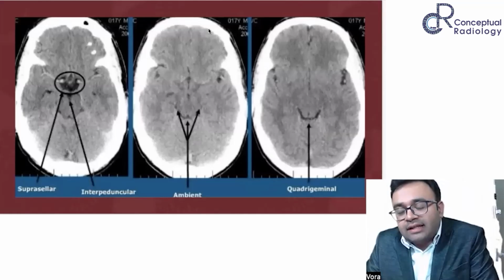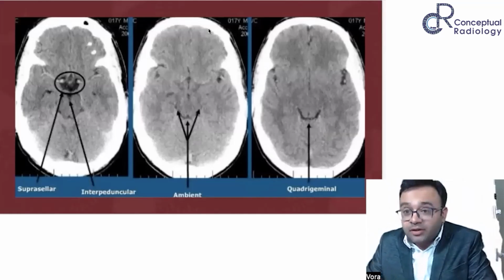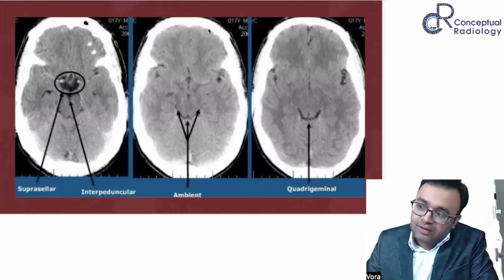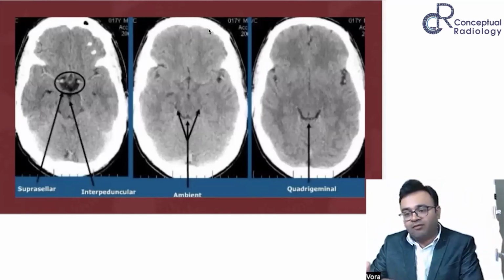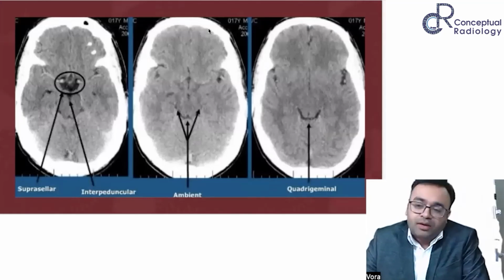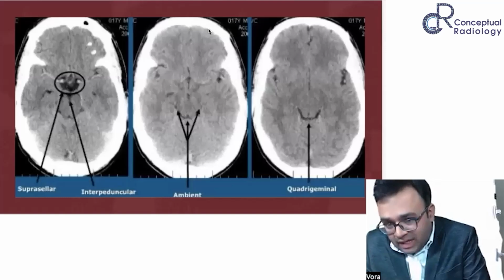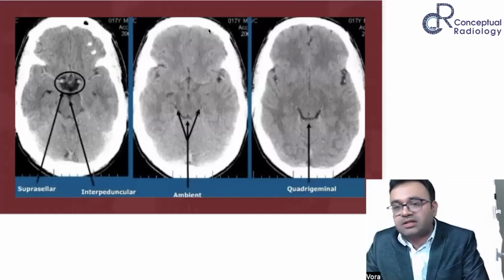What I've realized is that most radiology residents and neurosurgery residents also become too fixated with midline shifts. And trust me, if that is going to be the case, you're going to land up with a situation where you are going to end up losing a pediatric patient. First of all, for pediatric head injury, the brain is very, very robust. It is a very growing stage.